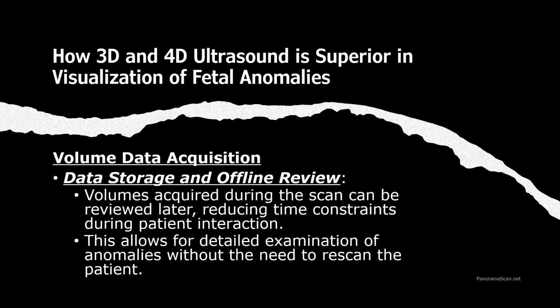Clinicians can take their time to analyze the volume data offline, ensuring a comprehensive evaluation and accurate diagnosis. This capability improves diagnostic accuracy and ensures better management of complex cases.